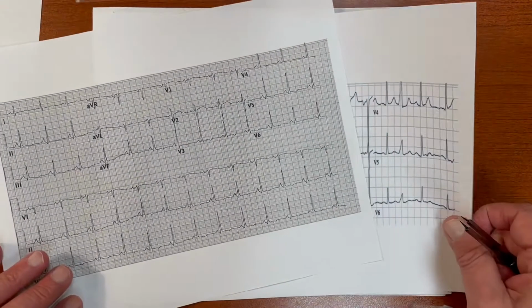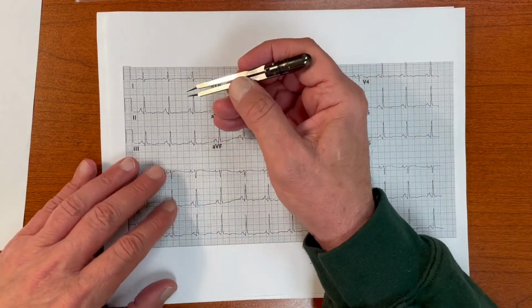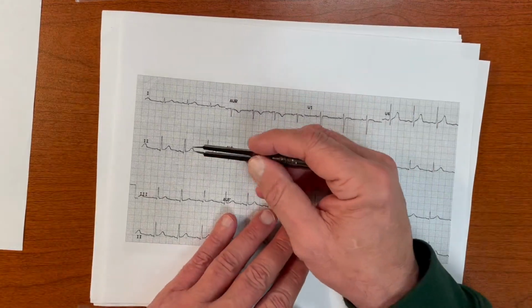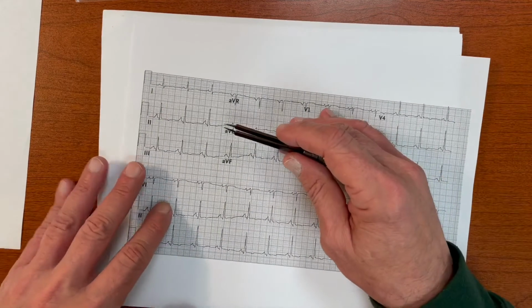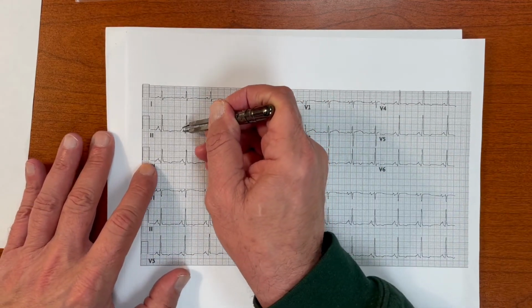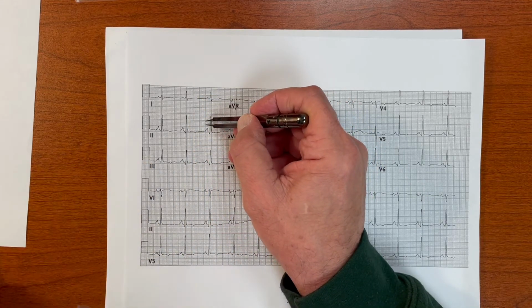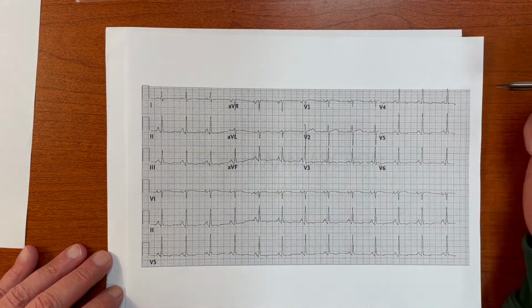And then for right atrial enlargement, remember right atrial enlargement is not about width, it's about height. And what gets your attention, if this was what a normal P wave typically looks like in limb lead 2, as soon as you look at limb lead 2 here, look at the height of that. And you just measure it with your calipers from the baseline, okay? And it's obviously tall, all right? So it's tall and peaked, so that's right atrial enlargement.